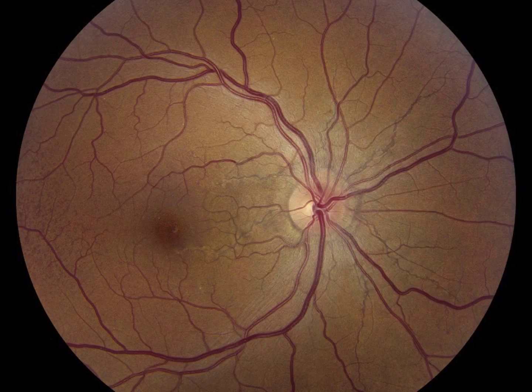And then the background coloration looks a little bit off, but you wouldn't know that unless you've seen this a few times or seen the next photo I'm about to show you. But you mentioned these kind of radiating little dark streaks coming out from the disc that almost look like blood vessels. And you mentioned a little bit of some kind of almost yellowish coloration going inferior to the fovea. And you mentioned these little tiny dots out here temporally.